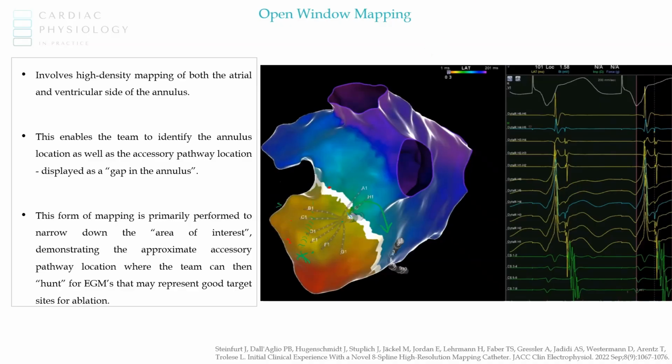So what would happen if we put our catheter closer to the accessory pathway? If we looked at the EGM on either side of the accessory pathway, and we place our catheter on this side of it, it's going to take a certain time for our RV pacing to reach that catheter, from the pacing spike to the EGM, which is obviously going to be a VEGM. It's going to take 80 milliseconds, like we said earlier.